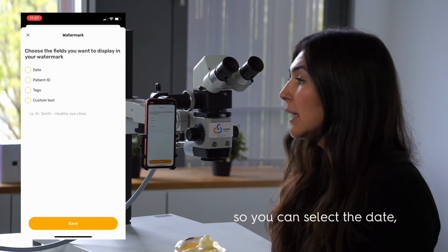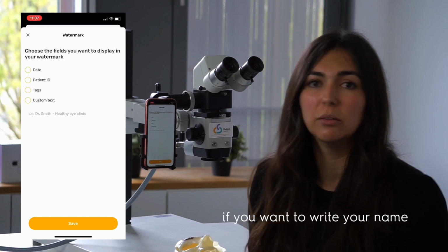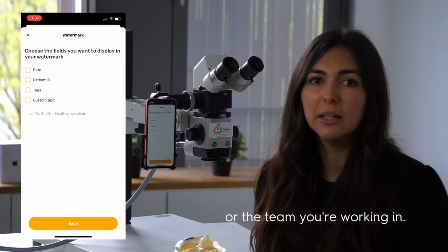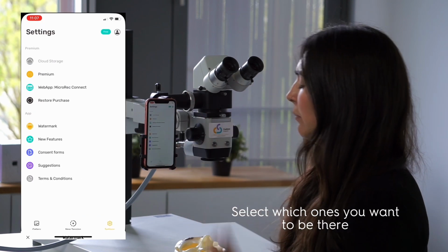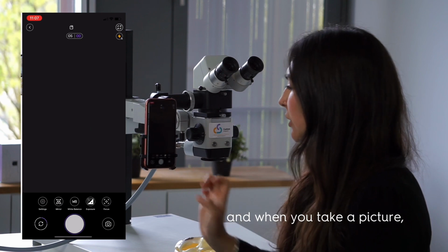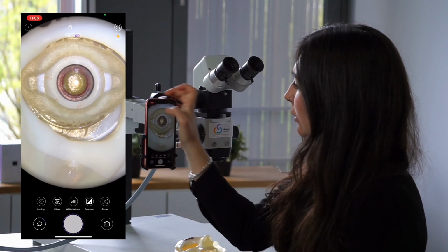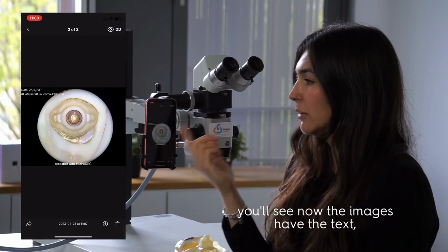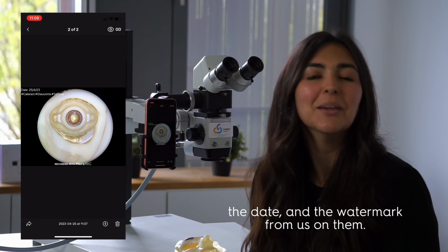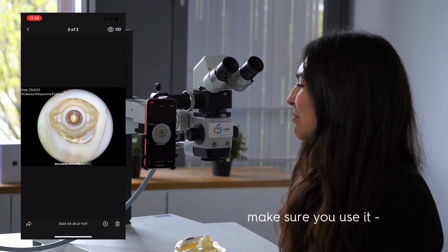So you can select the date, the patient ID, the tags, or some custom text if you want to write your name or the clinic you're working in. And basically you select which ones you want to be there. And when you take a picture, you'll see now the images have the tags, the date, and the watermark from us on them.